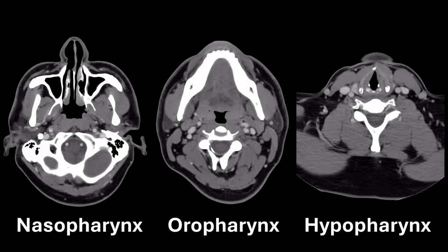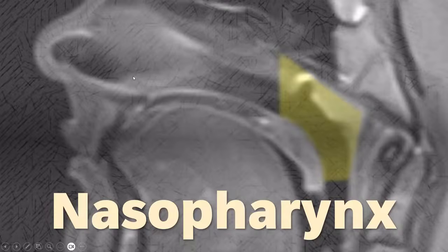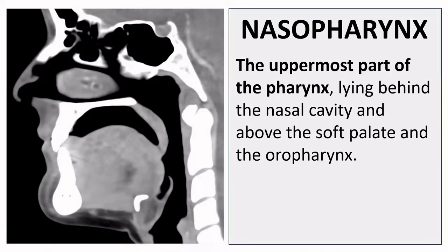So they have a quite conspicuous morphology, I believe, on CT images, and this morphology is caused by very specific structures. So without much further ado, let's start with part 2 of our discussion on imaging anatomy of the pharynx, and let's talk about nasopharyngeal anatomy. Okay, hello and welcome to part 2 of imaging of the pharynx, the nasopharynx.